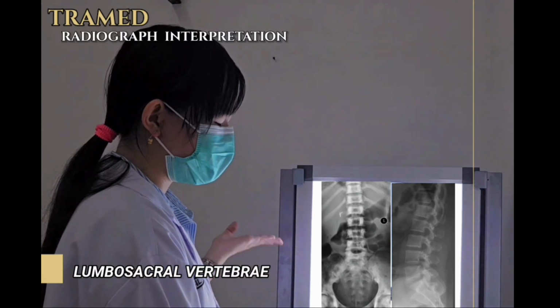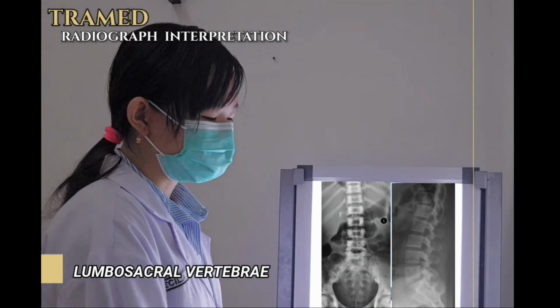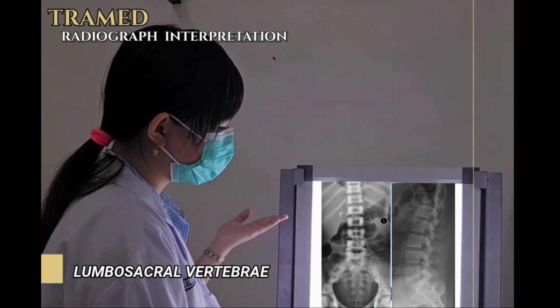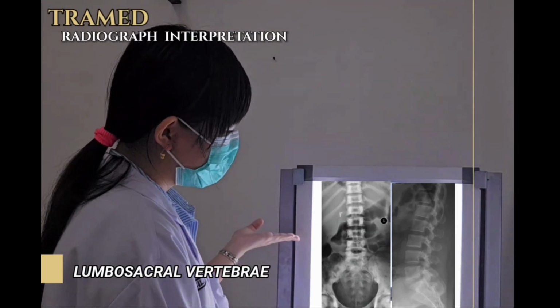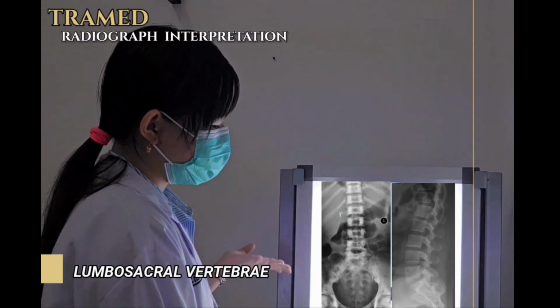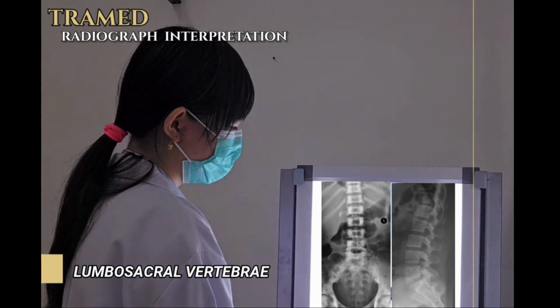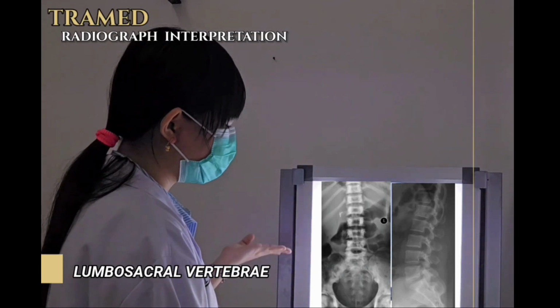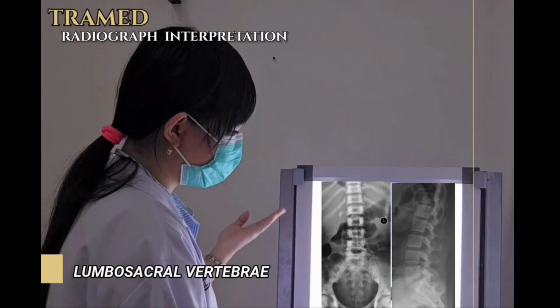And for the next, we must evaluate the lumbosacral lateral. The penetration is normal, it's adequate. We can see the L1 until S5, the greater sciatic notches superimposed. And for the next, we must check the lumbosacral AP or the lateral. L1 until S5 visible. The alignment of the curvature is okay, normal.